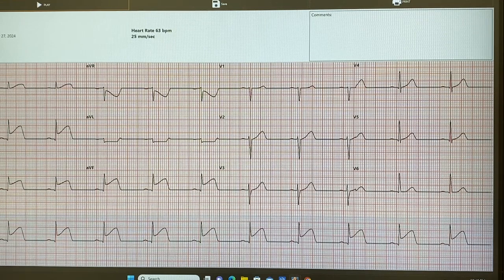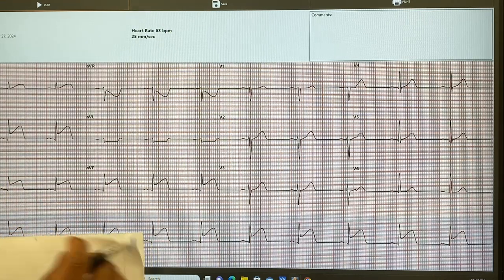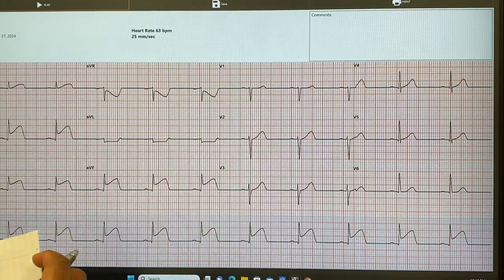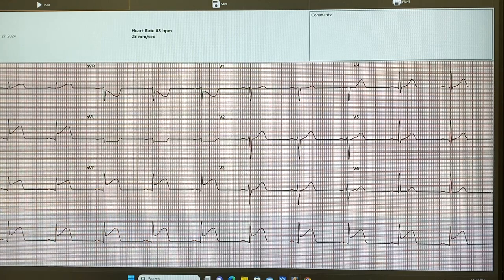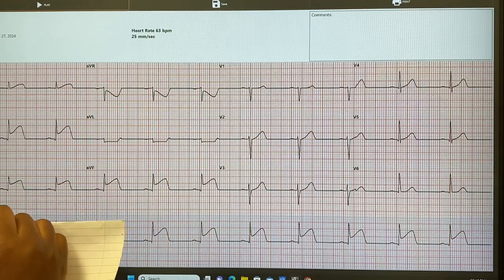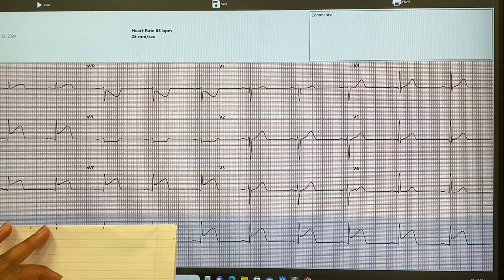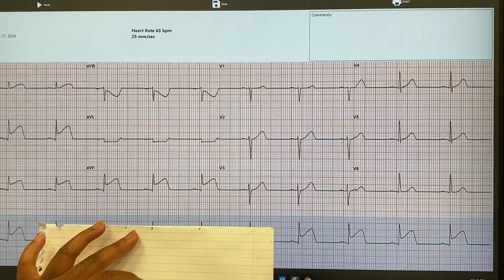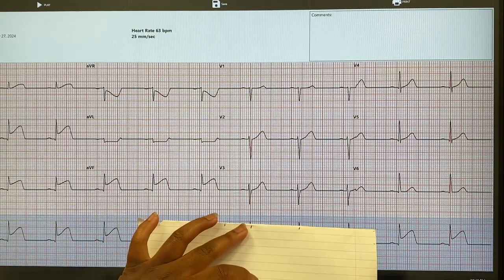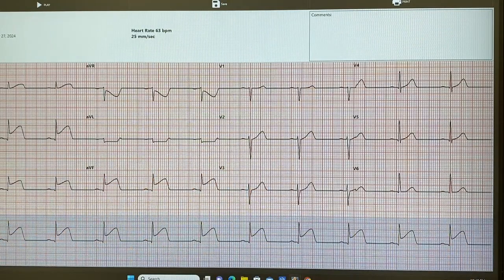Almost like a supraventricular. Okay, so rhythm is regular. Rhythm seems regular or not? Yeah, go through the motions. Remind me again, rhythm is from R to R. R to R, the very top of the R's. Pull the page inside out. Just hold it in a different area. You have so many lines in there already, my good patient. It's regular. Okay, regular rhythm and the rate.